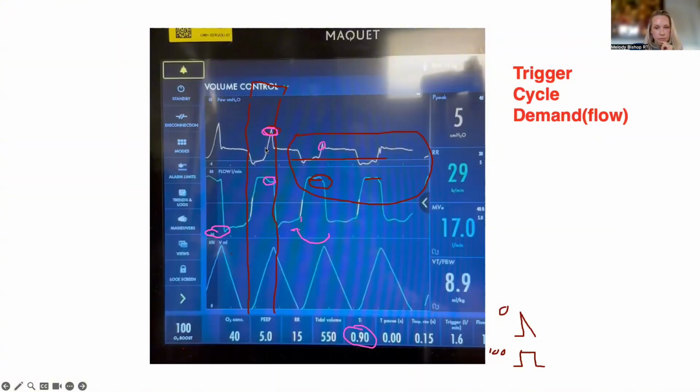So the patient either wants the flow to be much higher, or what is probably more accurate, needs more support. Then the second question becomes, why does he have such a high MV? If this is from metabolic acidosis, like renal failure or something like that, that could be the reason. It could be a big VQ mismatch, like a big PE, ARDS, or pulmonary edema, where there's a lot of dead space, so you need a massive minute ventilation to achieve a normal pH. But whatever it is, the vent at this point in time is certainly not giving the patient enough support to meet that demand.